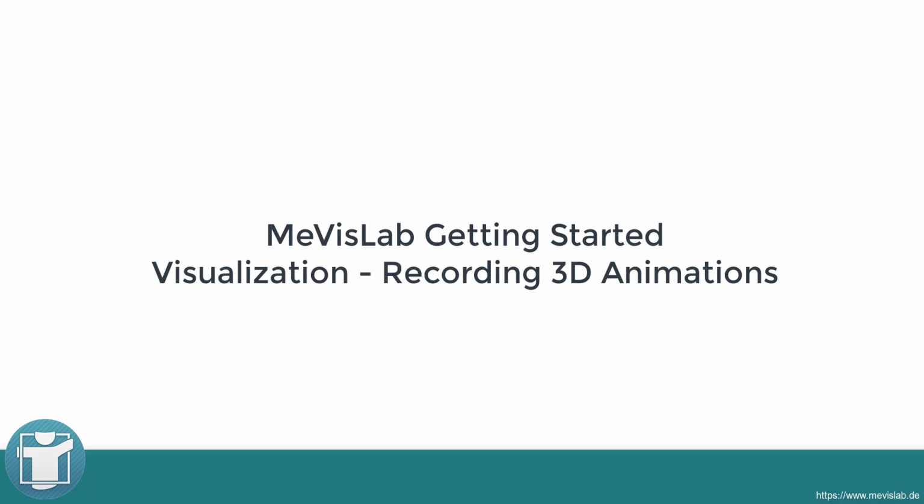In this video, we are using the module AnimationRecorder to generate dynamic animations of a 3D scene. We will be recording a video of the visualization, Vascular Structures tutorial. The URL of the tutorial is available in the comments section of this video.